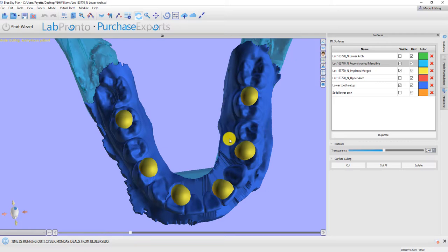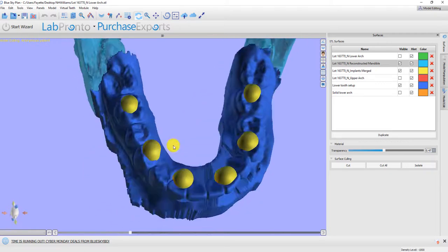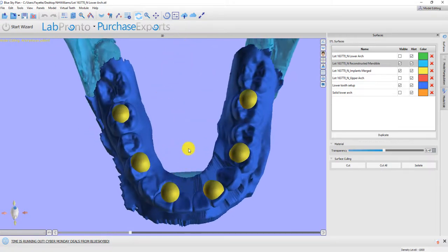The purpose of these is to create a 6 millimeter hole in the prosthesis, where we're going to digitally subtract these abutments from the blue prosthesis to make holes so that the temporary copings on straight multi-unit abutments can come up through the implants, through the prosthesis.